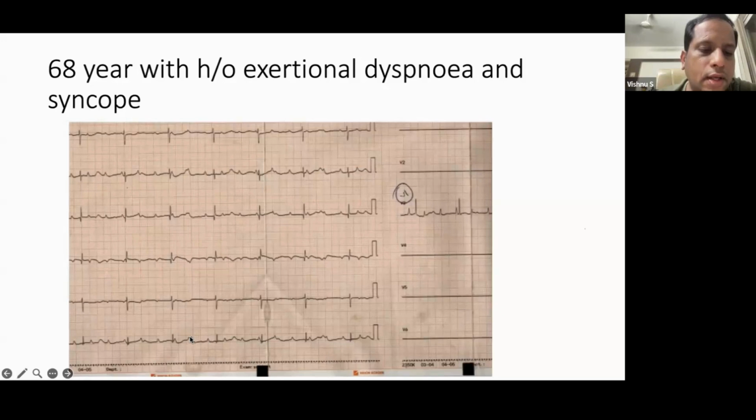You can see this T wave and this T wave morphology is different. Whenever T wave morphology changes beat to beat, or T wave height changes beat to beat, or the T wave is more pointed, then it can be a P wave falling in that T wave.